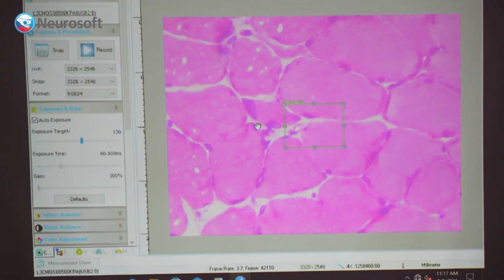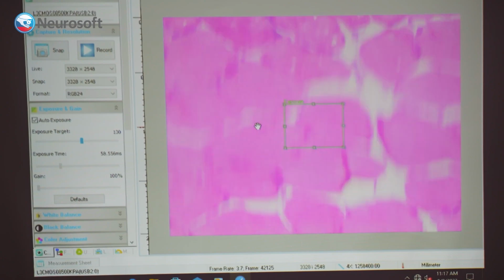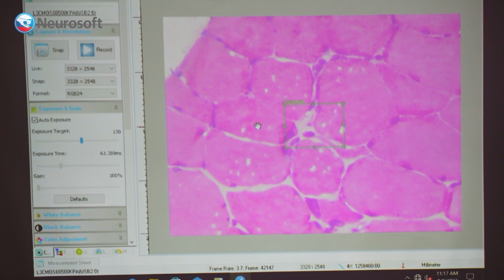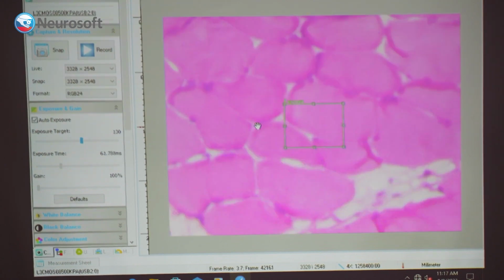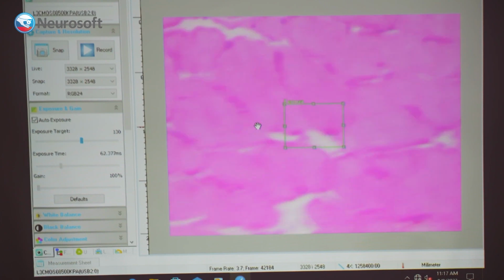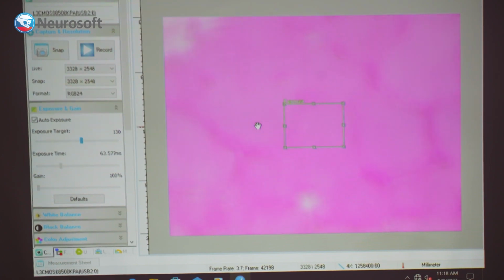So this is the only abnormality I found actually. Those are artifacts, right? The holes are artifacts, yes. But in other area, I don't see any abnormality actually. Well, of course, I sometimes find this type of fibers with internal like... What do you call it?